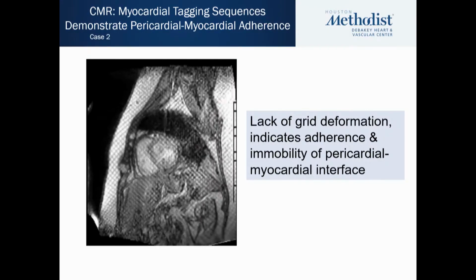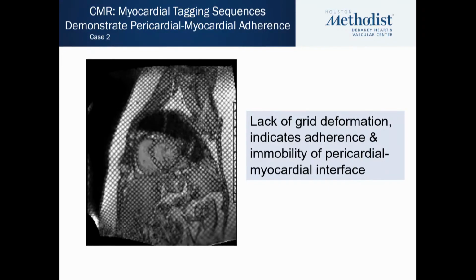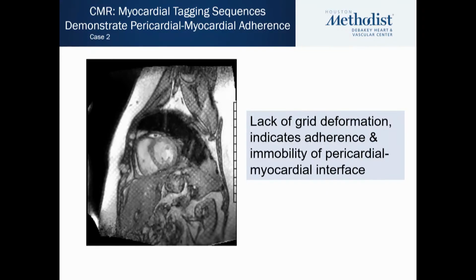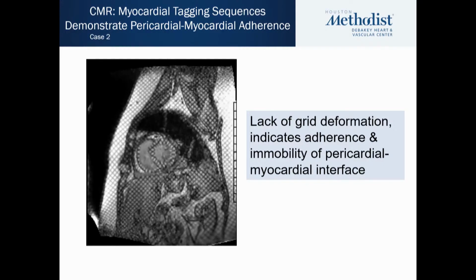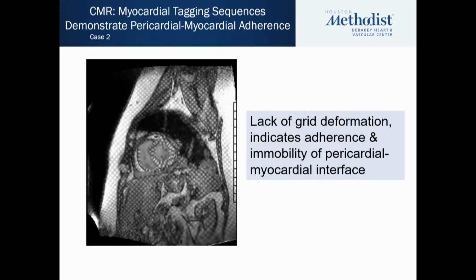You can also look at the interaction of the pericardium and myocardium using these tagged sequences, and as was mentioned, you basically do not see slippage of these two structures independent of each other. Rather, they seem to be adherent and moving together.